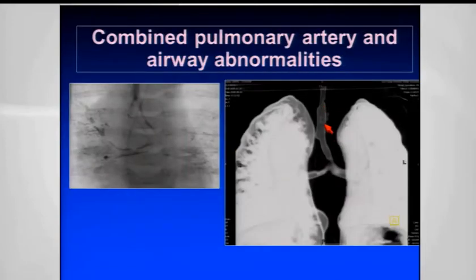The other nice thing is you get these volume-rendered tomograms, and you can see this is a child who had a traditional bronchogram under general anesthesia, contrast into the trachea, and you can see this very abnormal stovepipe trachea, long segment tracheal stenosis, little apical attempt at an accessory bronchus, not quite making it, and this very narrow origin of right and left main bronchus.